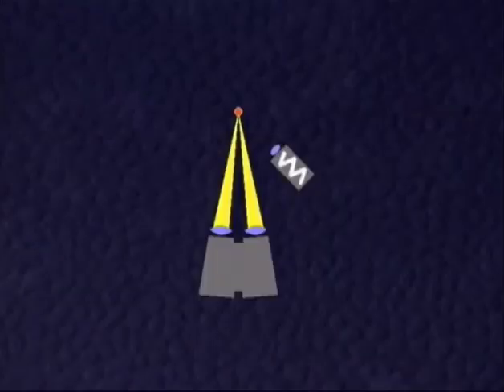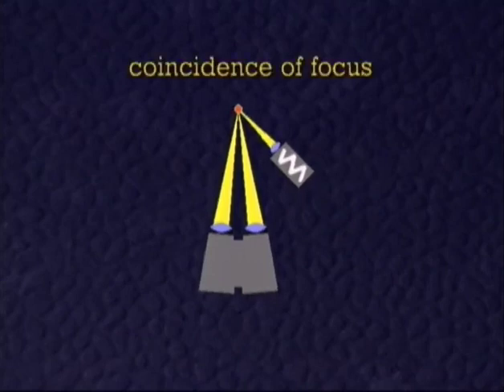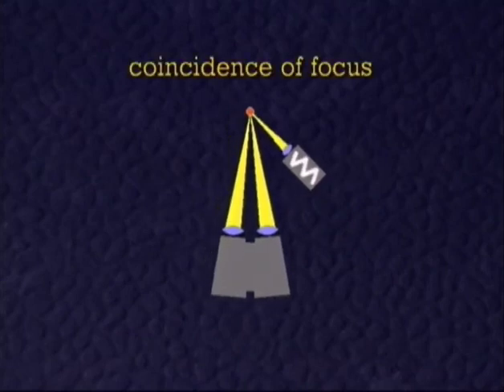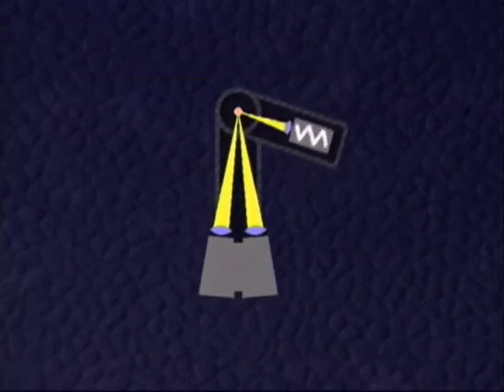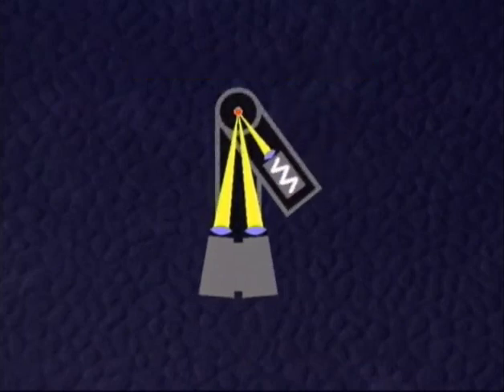For observing a sharp optical section, the slit light must be focused exactly at the point of observation. That means at the focus of the microscope. The coincidence of focus must be maintained during all movements of the slit lamp. Therefore, the coincidence of focus is set by the construction of the slit lamp right at the common axis about which both microscope and slit beam rotate.